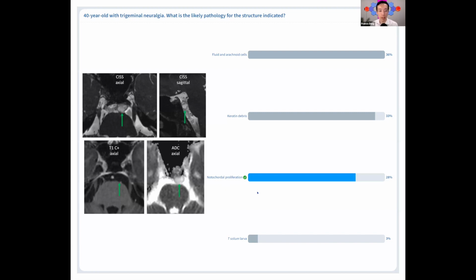In this case it was actually biopsy proven, because even though these are typically no-touch lesions, ecchordosis physaliphora is a no-touch lesion, this patient was undergoing neurosurgery for microvascular decompression of their trigeminal nerve, and because they were in the vicinity, they saw this as they were decompressing the left trigeminal nerve. They decided to take a piece, and so this was path proven.